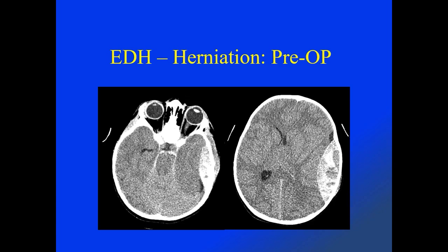This slide shows an acute epidural hematoma along the left lateral hemisphere convexity with biconvex epidural hematoma, with some of the hematoma demonstrating isointensity, suggesting a hyperacute clot with mass effect on the left cerebral hemisphere, causing left uncal herniation with compression of the upper brainstem.